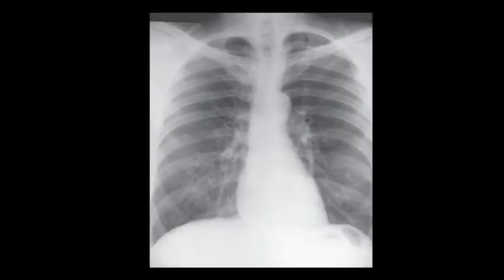So let's take a look at our first chest x-ray film. First we identify the view and then apply the mnemonic. As I've said before, the view most commonly used for chest x-ray is the PA view. So this is a plain chest x-ray showing the PA view or the posterior anterior view. Now let's follow our mnemonic. The first A was for air. As we all know, air appears black. So all the black areas are air.